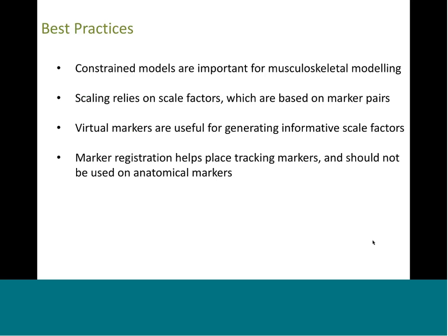Marker registration, another feature of the scale tool, is used to accurately place tracking markers, which is important when your method for calculating kinematics is minimizing overall marker error, but it should not be used to move anatomical or virtual markers.